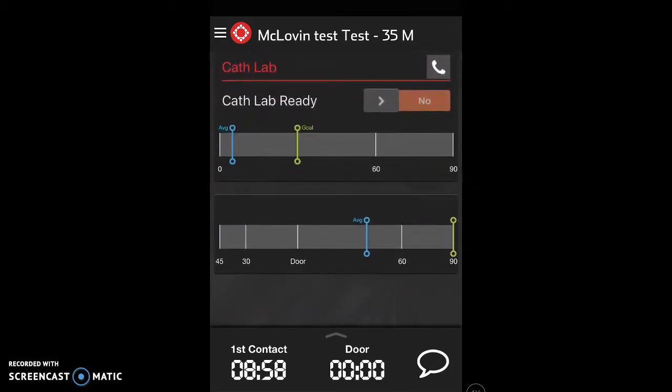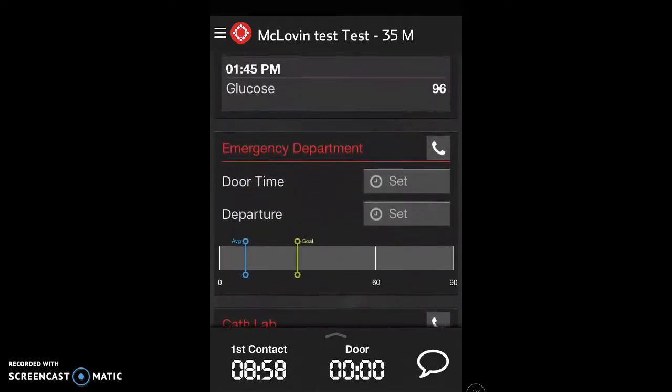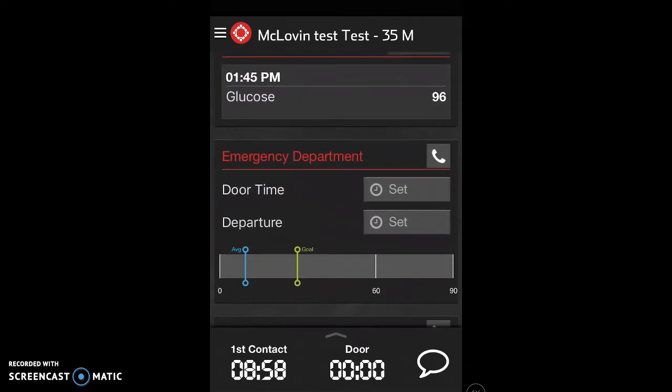So you can see as we scroll through here, the receiving hospital has the ability to add additional data to the case for their internal use that you would be aware of. Once again, once images have been captured in the software, they are retained on the software and not on the device itself, the phone or the iPad. Employees who are associated with a certain case or patient transport should not be able to see transports created by other users.